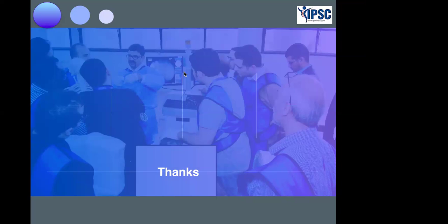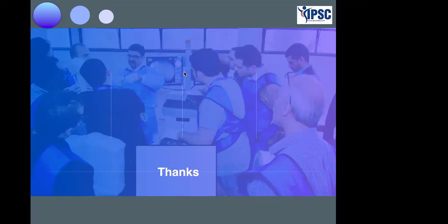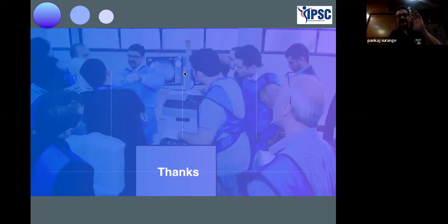So on MRI, if we see the edema is there, that means the source is still there. That means either the fracture has not healed completely, or a refracture has happened. So if the edema is there, you can proceed with vertebroplasty.